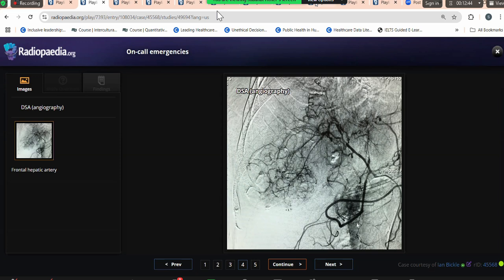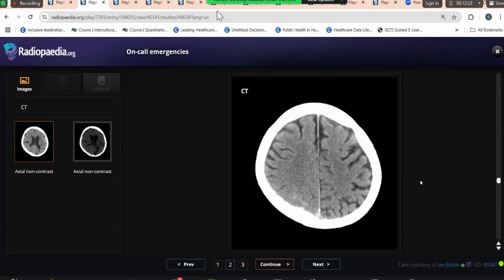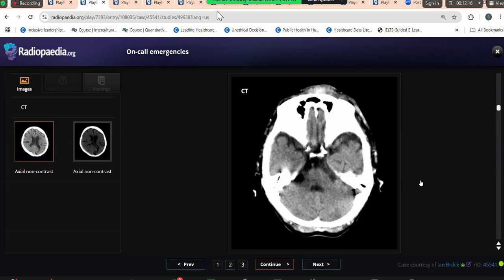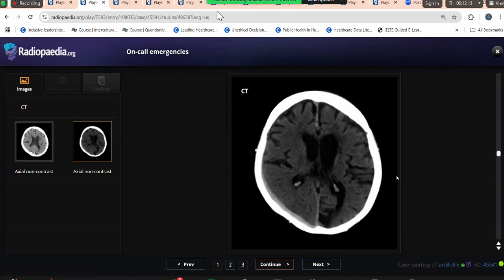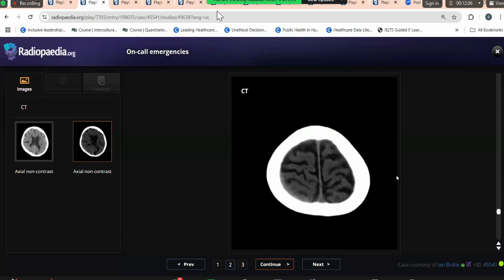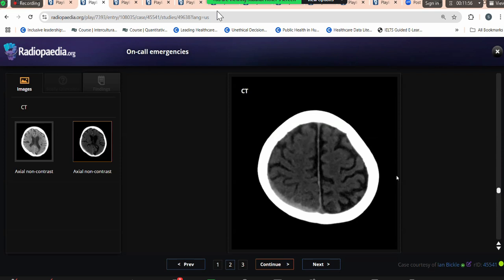Okay, this one, this is again A&E. You see, the reason I was putting these CT brains is that in the exam, once you say that I'm looking at the CT brain, but when a patient comes from the A&E with neurological deficit, I would like to see the image in stroke window. And that would make any examiner very happy, right? And he or she will immediately tell you, yes, you can change the settings of your windows. Yes, because in FRCR 2B you can alter the window, or the examiner will change it for you.